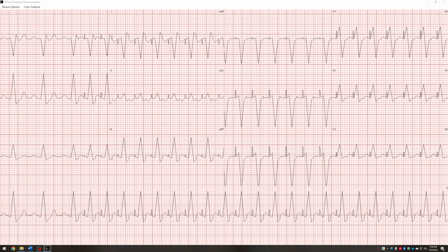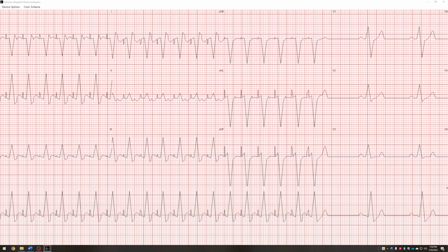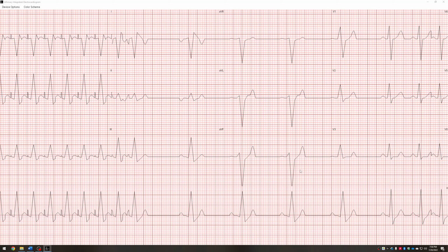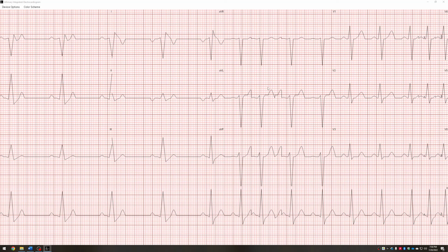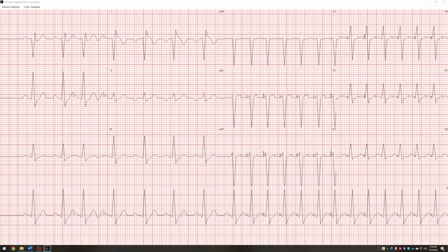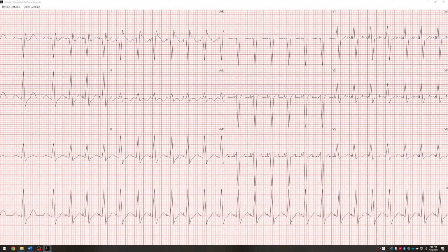So it's drawing a bit unrealistically with the tachycardia and the short QTC. But like I said, you can make different adjustments to all the different cardiac parameters and then see how it traces out so that you can prepare your educational materials or your live scenario, your simulation accordingly.